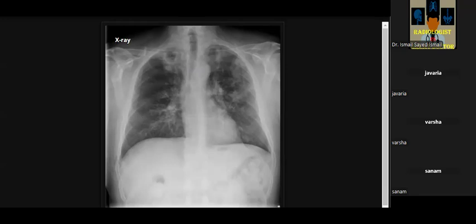Is this an emergency or not? So there is a relatively reduced lung volume on the left side. It's fibrosis with cavitation, but does the presence of cavitation carry any emergency? Yes or no? Yes, it could result in pneumothorax and is concerning for fungal infection.